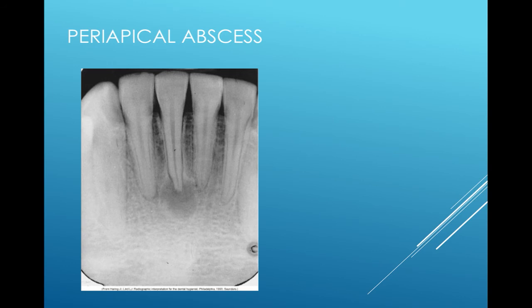Why is that? With an acute infection, the bone might not be as deteriorated as it would be with a chronic infection. Remember what we talked about with caries interpretation: in order for something to appear radiographically, it has to be more advanced. It's the same thing with caries. In order for periapical pathosis to appear in a radiograph, it needs to be pretty advanced before you see it. So acute may not be advanced enough for us to see. Chronic, however, will be advanced enough for you to see on a radiograph.